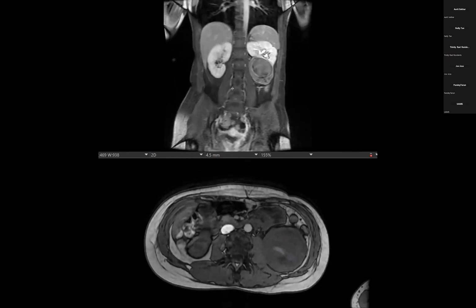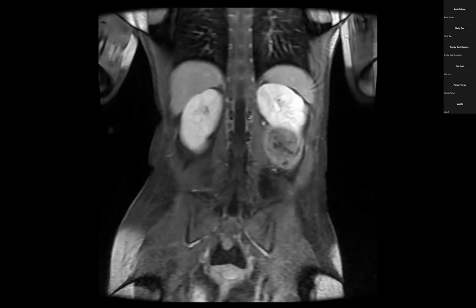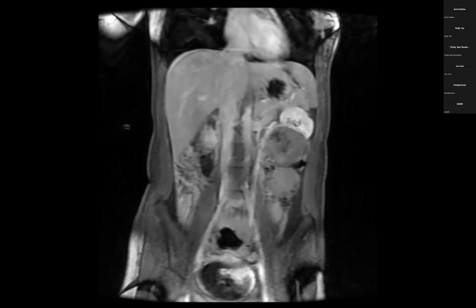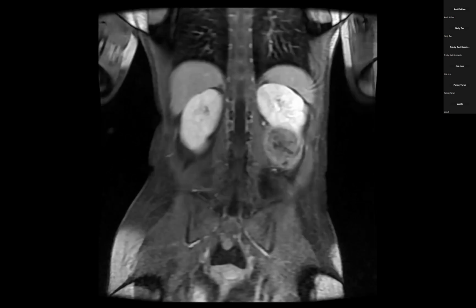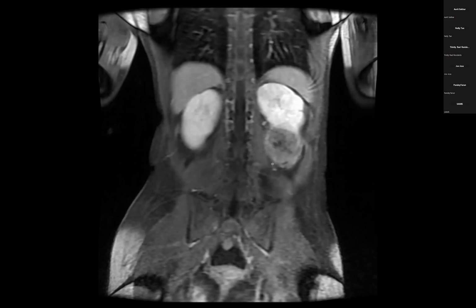Okay, the patient is now someone in their early 20s. Diagnose this. Is there something hereditary? Early 20s. Would it be medullary? Medullary renal cell, like in sickle cell? Yes, it can be, sure. I don't know, medullary is so rare. They usually don't really know. They're aggressive. This looks more well-defined to me.